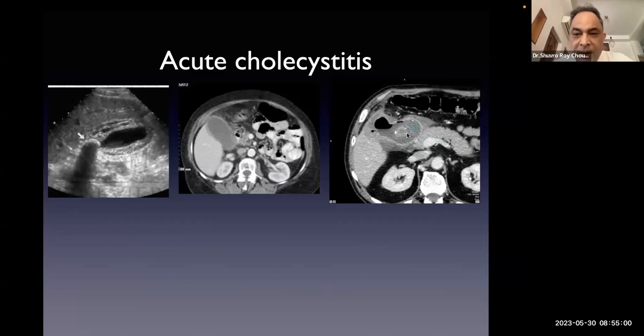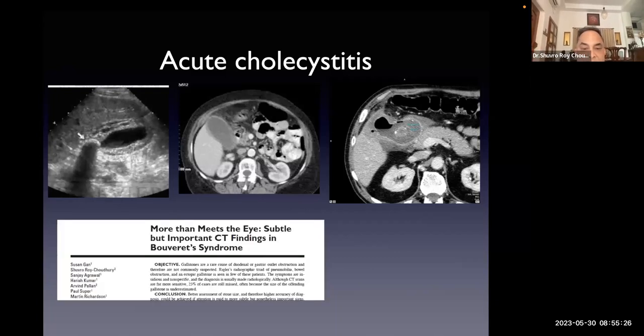But no, because of the cholesterol content of the stone, you're only seeing the calcific part of the stone. If I look very carefully at the density of this versus this is denser. So this whole thing is the stone. And this is a common surgical or radiological pitfall. This is actually an emerging cholecystoduodenal fistula in a patient with a large gallstone and will cause gallstone obturation.